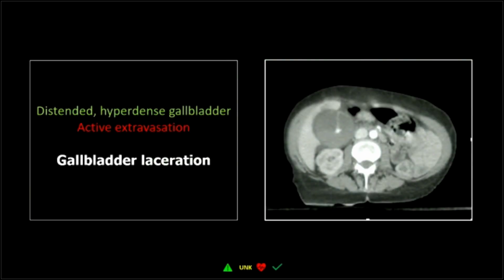You don't see many gallbladder lacerations, and you don't see any like this. All the gallbladder lacerations I have in my collection, I have a decompressed gallbladder with a defect in the wall, right? It's because as soon as you rupture your gallbladder, it just deflates. But this one Sean put in, and it's actual hemorrhage. So you can see the layering clot in this very distended gallbladder, but it's incredible. There is actually hemorrhage originating from the anterior wall, and it's just bleeding down a tiny channel through that blood-filled gallbladder.